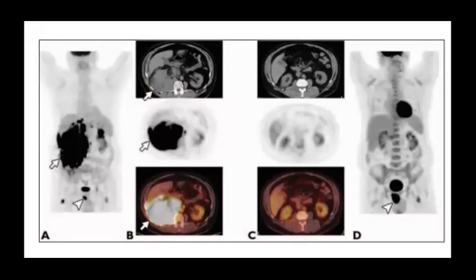Why? Because you can give this patient treatment, and after treatment, he will have a marvelous response if he takes the suitable chemotherapy. So this is a good example, and also a good example for the pitfall of bone marrow hyperplasia. He also wants to show you that they mentioned there is some residual focal uptake in the left proximal femur, and maybe it was suspicious in follow-up.